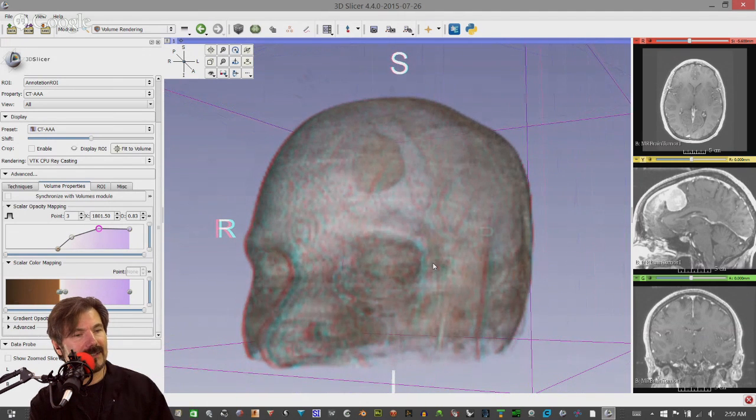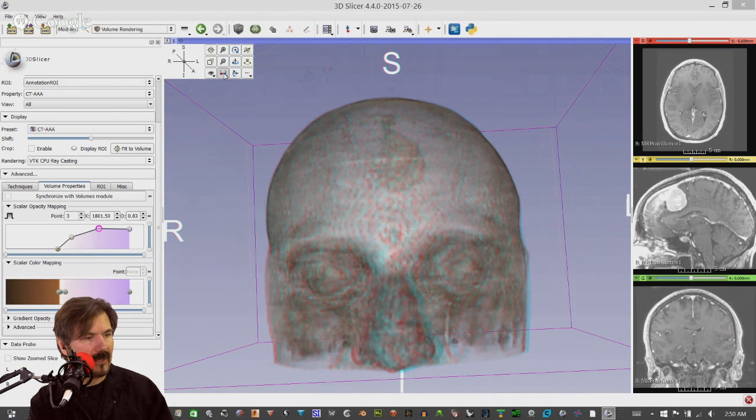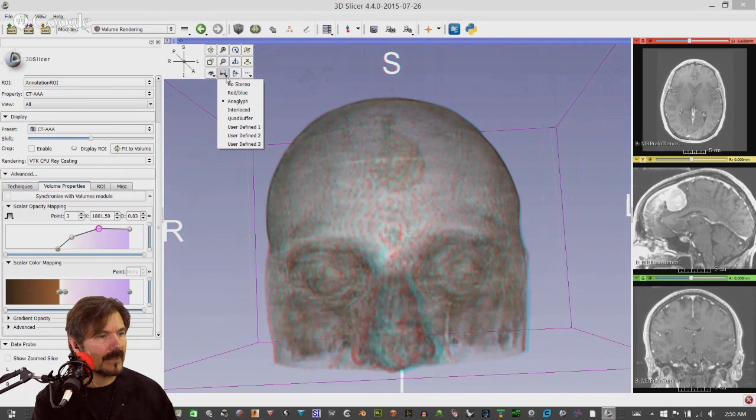And another feature that somebody's written, I have to see if they've created a new plugin, but if you have the Oculus Rift, you can get a plugin so you can look through Oculus Rift glasses. So it is kind of cool. Let me go ahead and turn it off again. Yeah, for some reason, there we go.